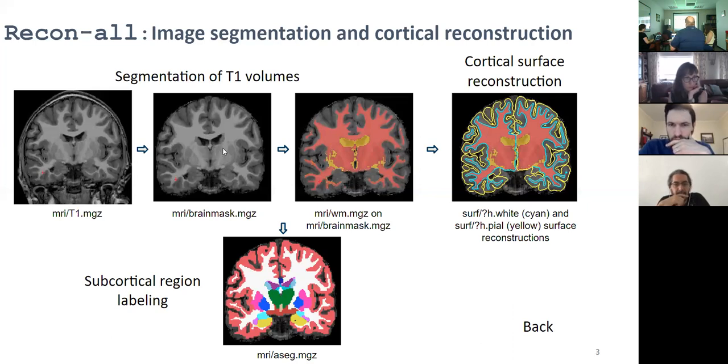So it's doing that. One of the things that we considered playing with, but from a time standpoint we didn't, but I would love if somebody actually wanted to do this, I'd love to work with them, is applying filters. You can try to apply some filters to data that's poor, to get rid of noise, or try a different type of intensity normalization, maybe more local, because I think that would make a big difference.